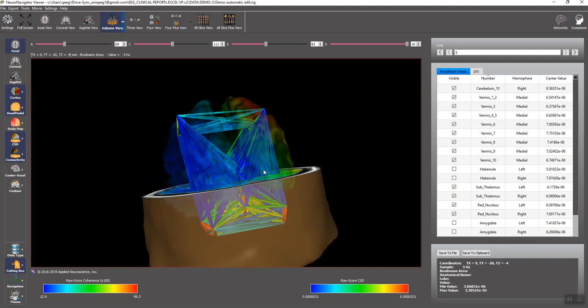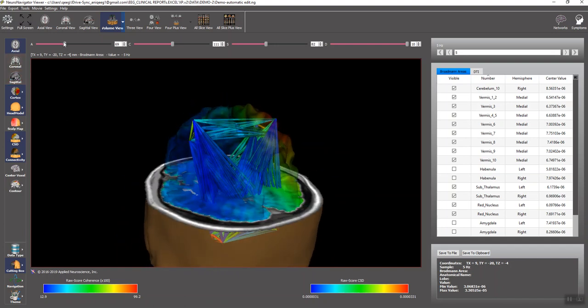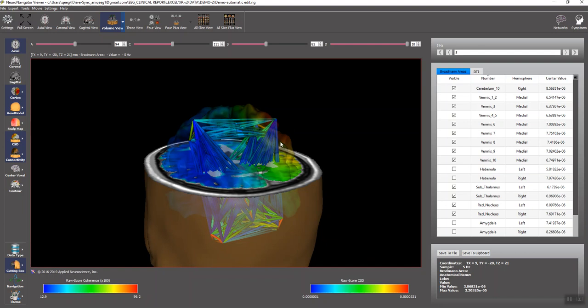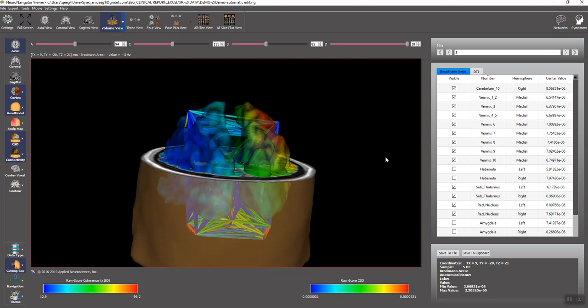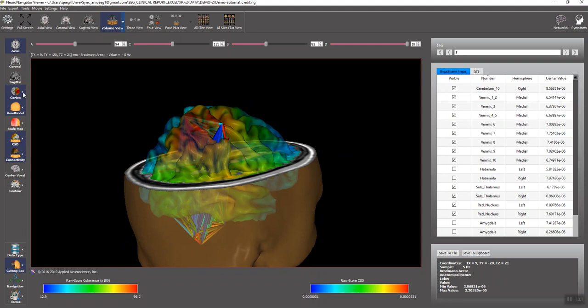That helps give you a view now of, and you have to move this around, get used to doing that. I can move this slice up and down so you can see where his pathology is, which is right up here. The right parietal lobe is where he was injured. I can make the cortex less transparent. So one can see the current density change, very big asymmetry because the right parietal region has been damaged.